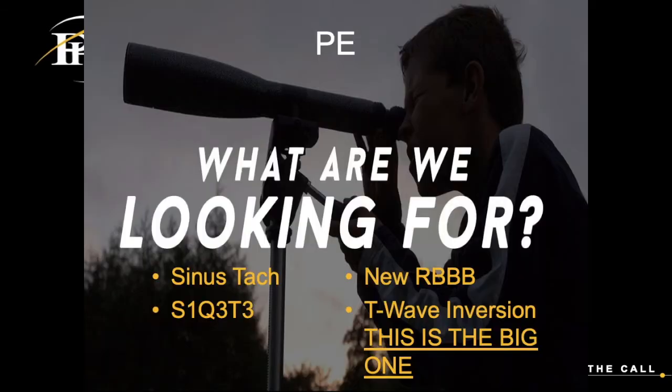All right, so what are we looking for in a PE? A lot of people want to look for sinus tach, and that's all good, but sinus tach is generally only present in about 50% of pulmonary emboli, so half of pulmonary emboli are not tachycardic. Everybody likes to look for that S1Q3T3.